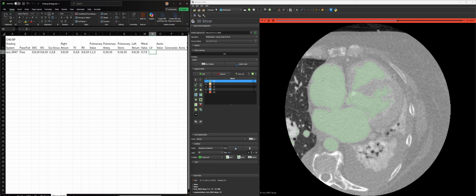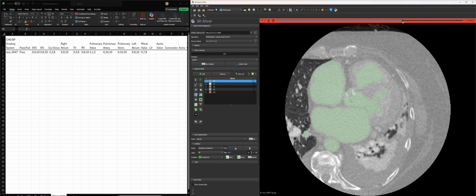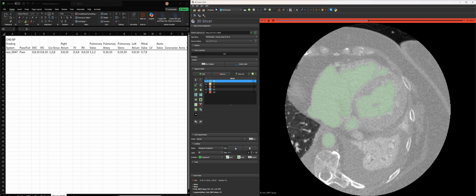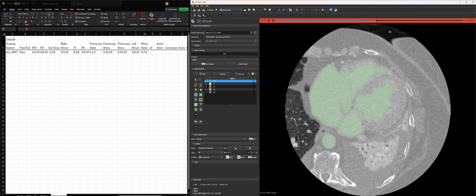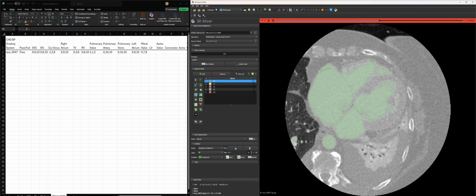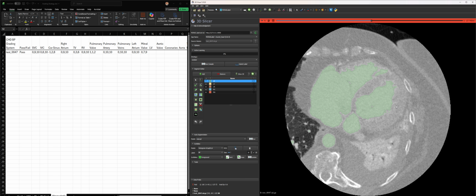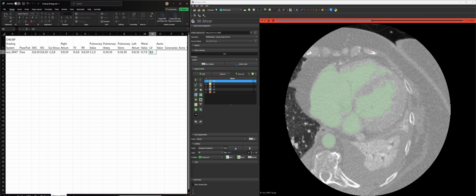All right, left ventricle. Again, it seems like there's opportunity. I think I would have liked to have seen some around that a little more. So I'm going to give that a pass. 0, 9, 10.